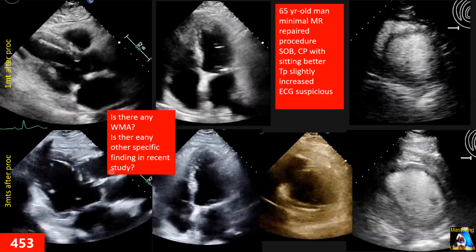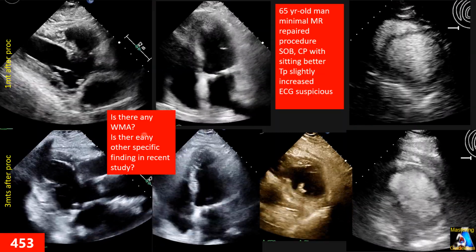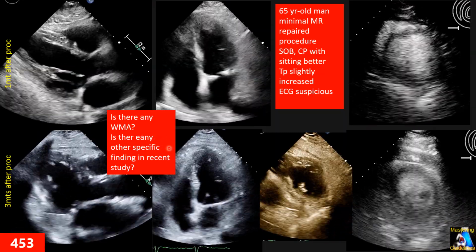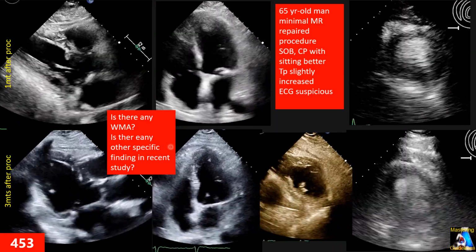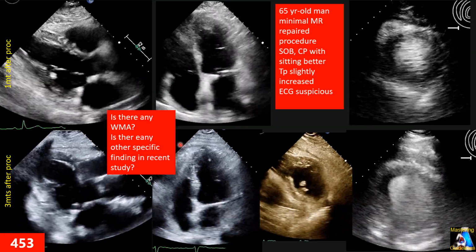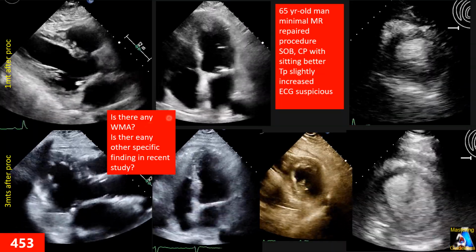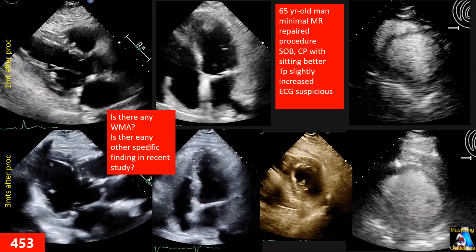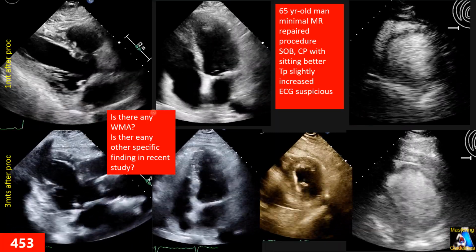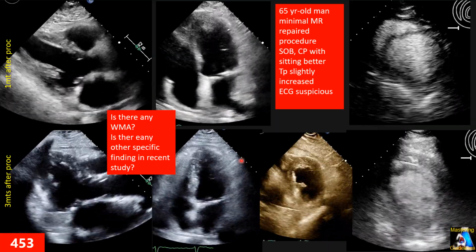What is that? Second, what is the mechanism of that wall motion abnormality? Is it ischemia or non-ischemia, and what exactly is the specific cause of that wall motion abnormality? Third, is there any specific finding that is completely obviously different between 1 month ago and the present time? Is there any specific finding you can point out and explain?